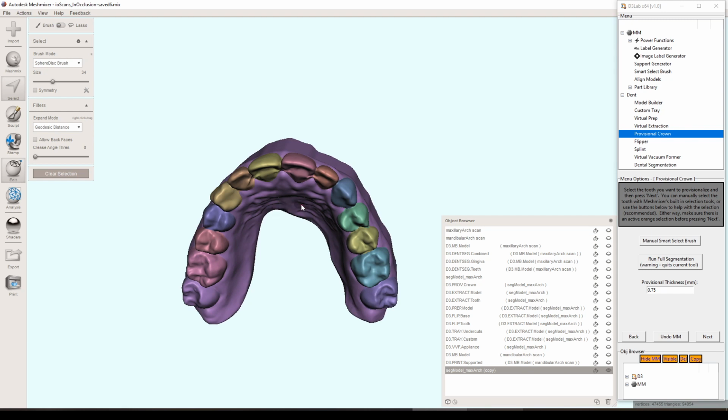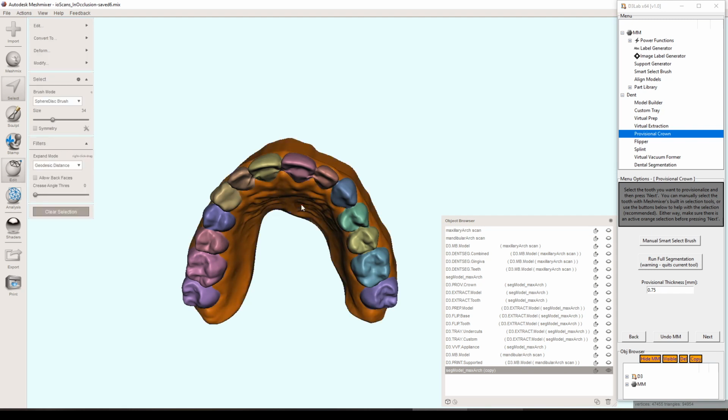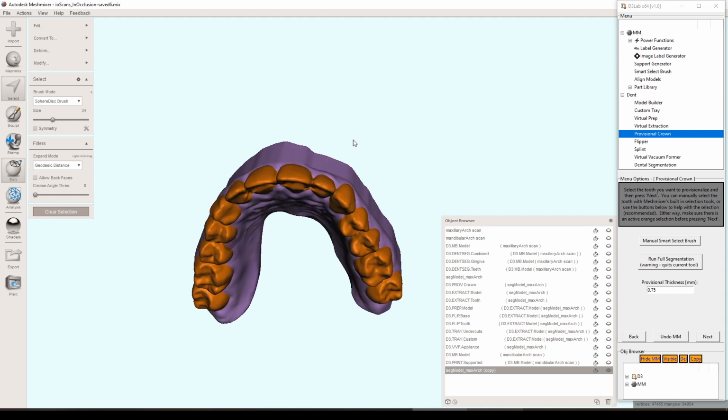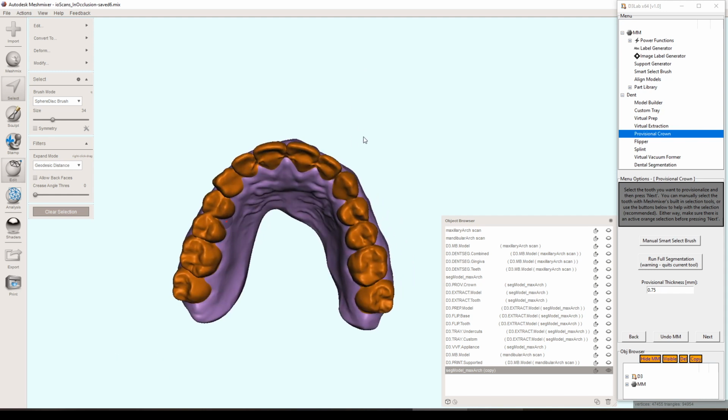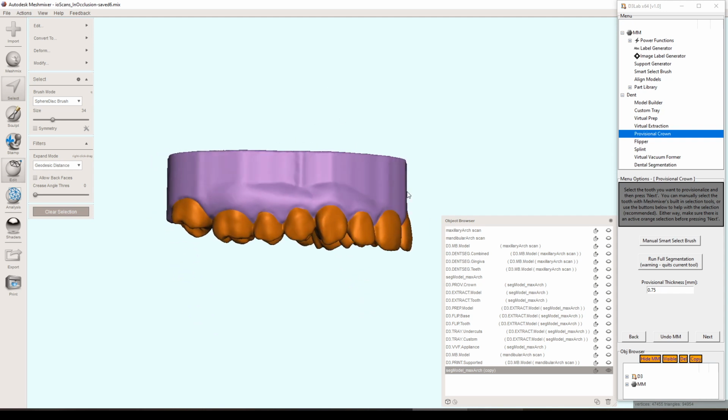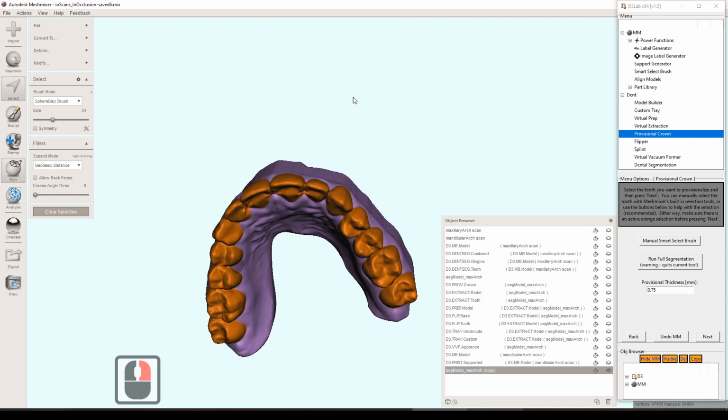Actually, I'll click on the gingiva, and I'll hit I for inverse, and I'll hit O a few times, I guess 5. I love having this down here now because people can see what I'm doing with my keyboard, because I just subconsciously press these keys. I just have them memorized. But you want to hit O quite a bit. It optimizes your selection, so it gets these little triangles that maybe weren't included. It includes them.